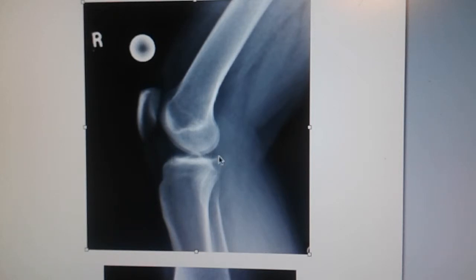And this is open because the central ray was angled, which you can tell because the medial condyle and lateral condyles of the femur are almost superimposed. And there is an adductor tubercle that you can see on the medial condyle so you can tell which one it is. I personally don't see it in this image. I'm used to seeing a little line that kind of goes this way, but I don't see it. So maybe this is it here. That might be it.